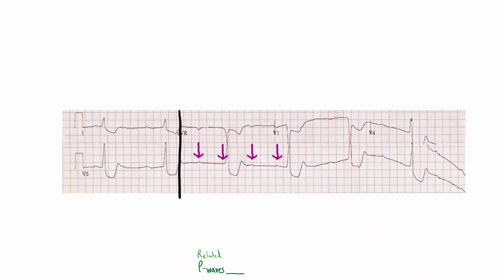Now we ask whether the ventricles and the atria are communicating by seeing if the P's are regular. Start with the consecutive P's. The P's are regular here, which is concerning for a high-grade heart block. Of note, it takes some practice to see P waves buried in other parts of the waveform. When we see that the R waves are also regular, it pretty much confirms complete heart block. The P's and R's are regular and unrelated.